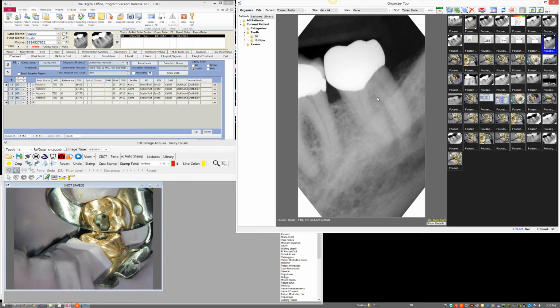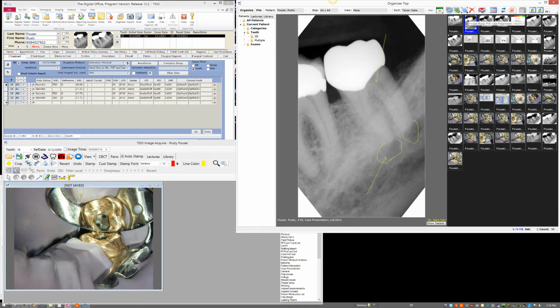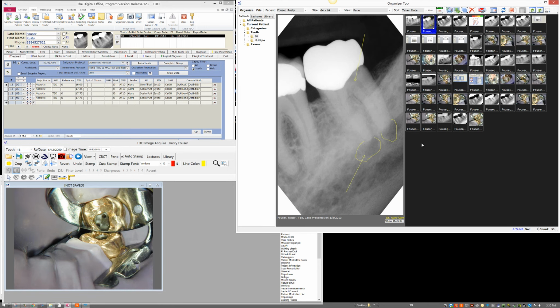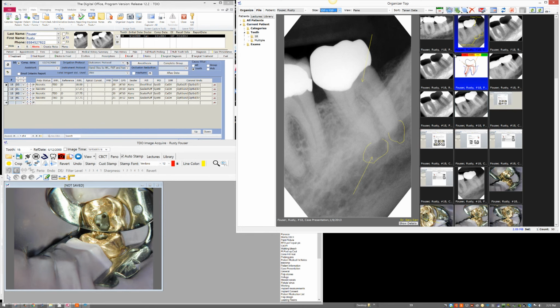So now with more vertically oriented pictures, and I notice Mike takes a lot of vertically oriented radiographs, you have solutions here for both horizontal aspect and for the vertical aspect. And now you can see the entire vertical dimension of the radiograph. And obviously you can size these appropriately, however large you want them. And you can keep your thumbnails larger so you have a higher mag view of the thumbnails.